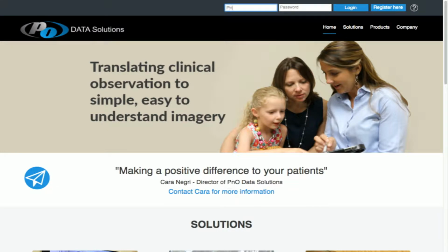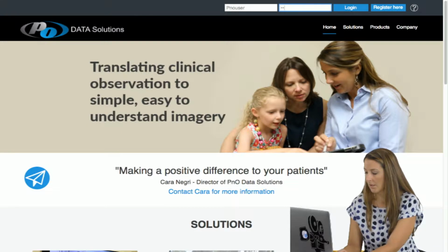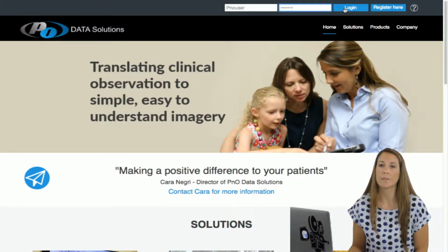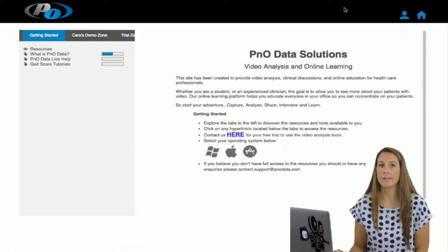Okay, so we'll go ahead and get started by logging in. And again, if you've used the apps in order to get your videos up into the web, then your videos will already be in there and you don't need to worry about it. I would say refer to our other video tutorials on how to get your videos up into the web-based software. So we'll go ahead and log in.